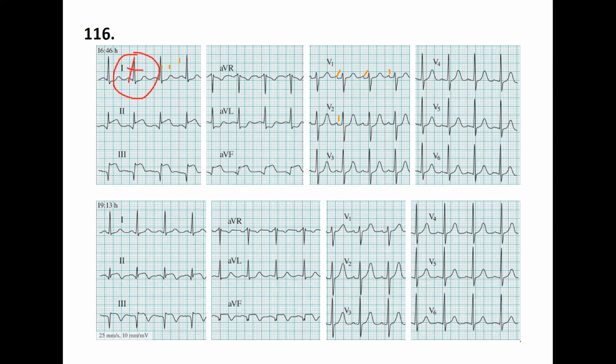No, no. Now, this is why it's difficult to see, but this is how the AVF looks like. Yes, this is the R wave, so it means the positivity is bigger than the negativity. So I would say that's positive. This is a positive ST elevation that goes for MI, which we haven't studied, so it's very far from now, but this is a little bit of positivity. So it means lead 1 and AVF are positive, so that should be normal, okay?